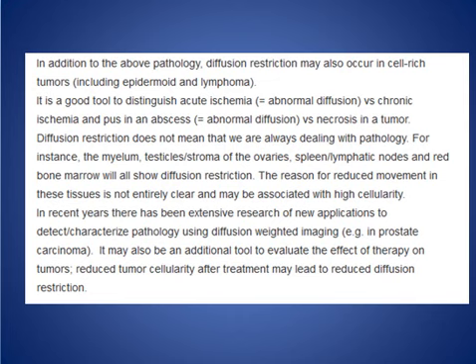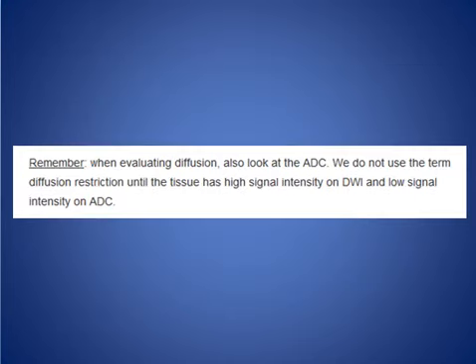We also see it in cell-rich tumors like lymphoma, epidermoid, meningioma, etc. And when we see the diffusion weighted imaging, we should also look at the ADC map.